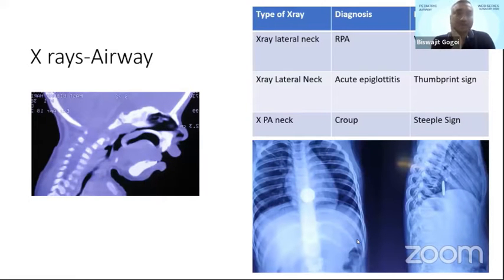But before going to CT, we should not forget the X-rays, the classical X-ray, which we mostly use in common OPD practice. We prefer X-ray nasopharynx for enlarged adenoid, in case of OSA or nasal obstruction. And as today there was a very good session on foreign body by Counselor, these are another most commonly prescribed X-rays for foreign body.